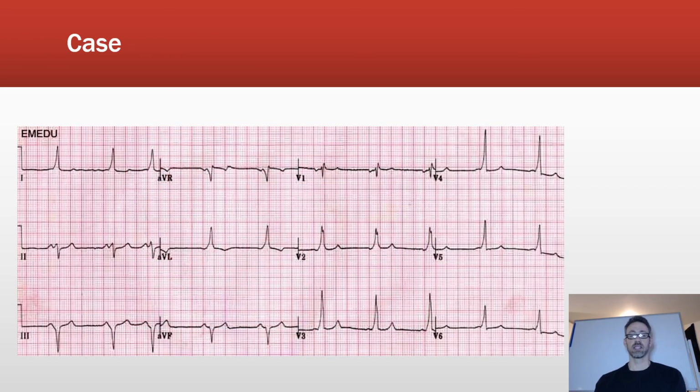Okay, so in this case, this particular ECG has a few things going on, and so we're back to our standard 12. For this, you should be going through your standard approach, starting with calculating a rate. So let's do that really quick to make sure we're all on the same page. Let's take from here to here. All right, those intervals there. So let's take our heart rate.